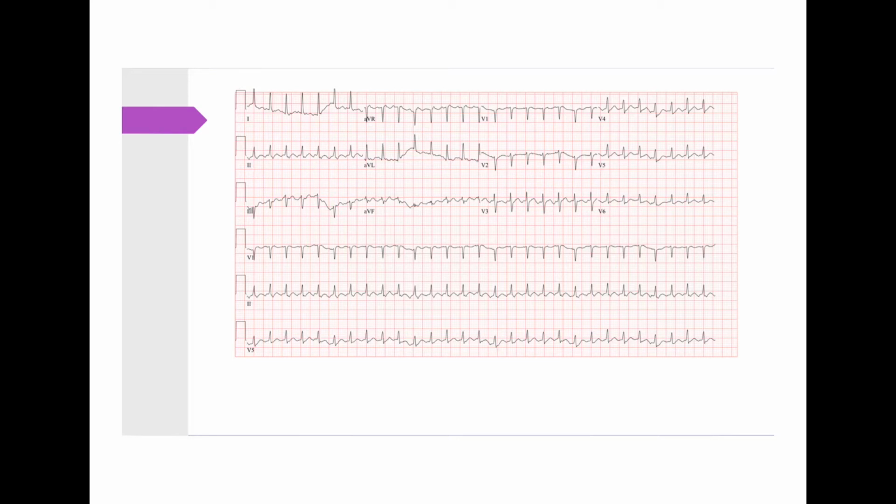Here's an example of atrial flutter from an actual patient, and we typically look in lead 2, and here we see negative deflections. There's one, and they look like they're about one big box apart, which is consistent with flutter because the sinus node can't fire at 300 times a minute. And the rhythm overall is pretty regular, so the QRS complexes are about 2 boxes apart, so that gives us a diagnosis of atrial flutter with a 2-to-1 AV block in this case.